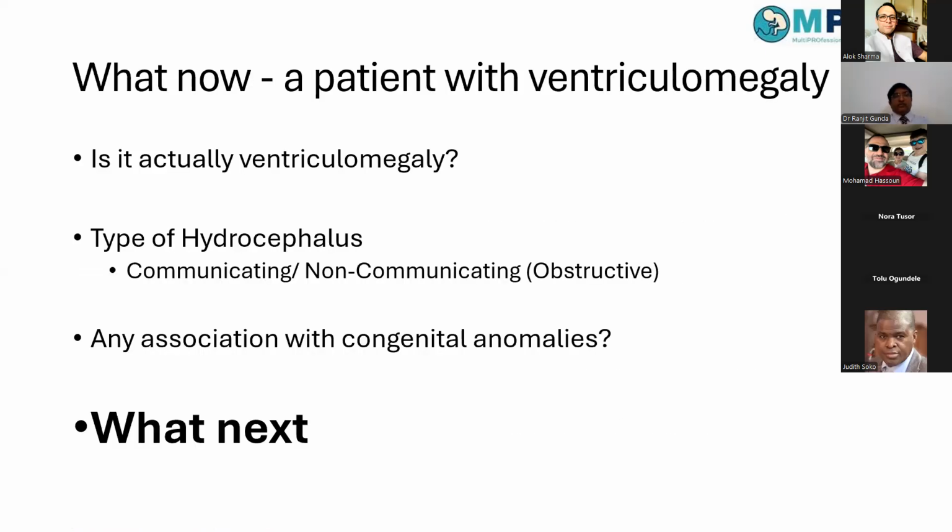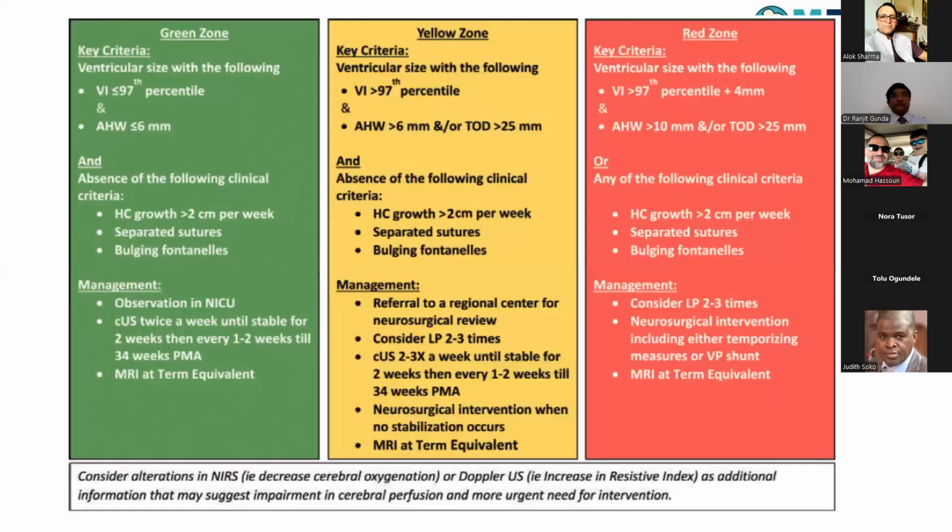So we talked about whether we want to see ventriculomegaly or not, which type of hydrocephalus, and any association with congenital anomalies. And so we come to a picture of what we are dealing with and what next.